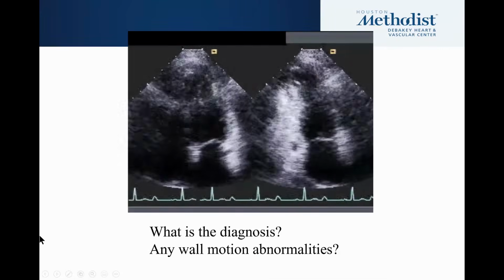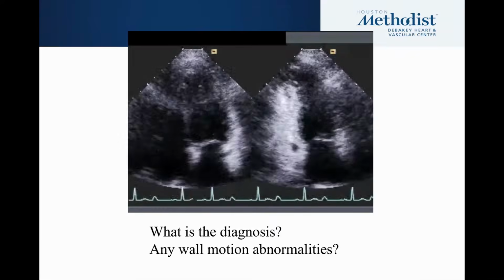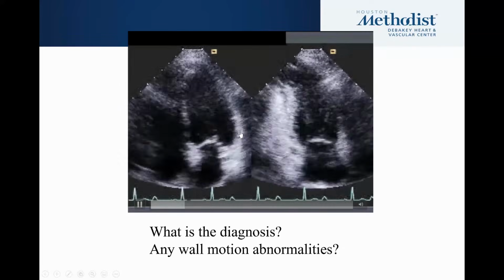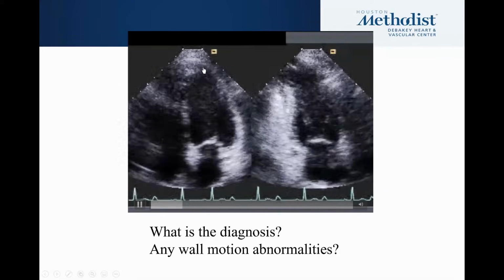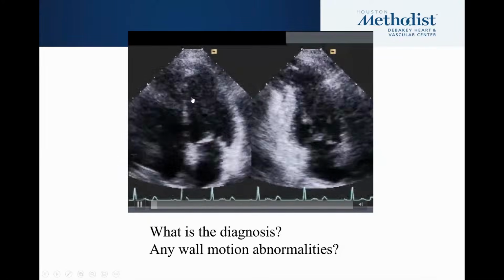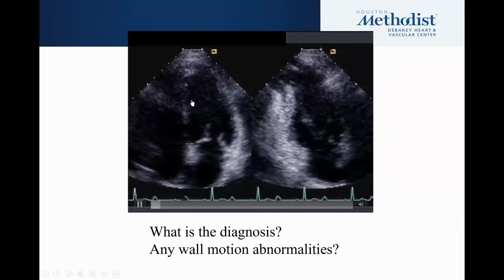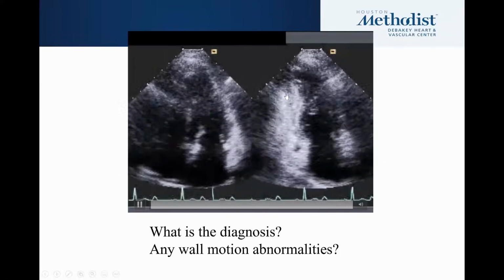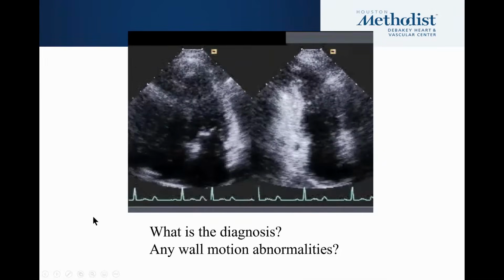These people can be suspected from an EKG because they have these typical deep T-wave inversions on the ECG. And one thing to remember, again, for sonographers in the audience, is that if you see something that looks like maybe a hyperdynamic heart, but you don't see well the apical segments, there's attenuation, think of apical hypertrophic cardiomyopathy. What happens is that all these muscles here produce attenuation of sound, and you don't see it that well.